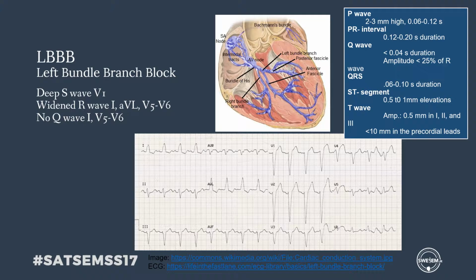An intact conduction system will activate the heart to a depolarization pattern that starts from the left side of the heart and moves right because of a quicker conduction system on the left side. In the case of the complete left bundle branch block, there's a reversal of this depolarization for a moment, as the depolarization of the left does not receive direct information from the bundle of His, but instead from other intact conduction pathways.